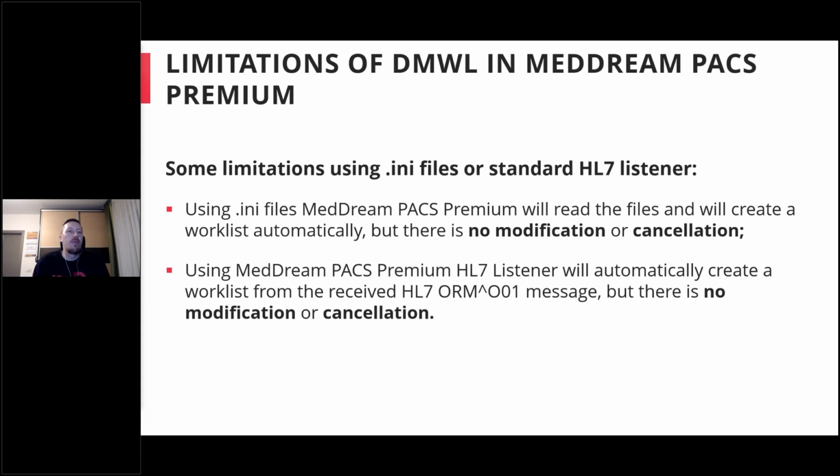Actually, if you have exactly the same information in two files, and you import them, for example, with the same patient ID, same procedure time, same title, and so on, it will create two worklists, so it will be a duplicate in this case.